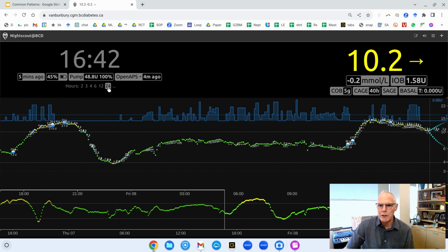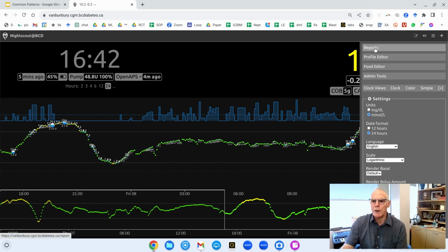Let me see, anything else I want to show you? Not really. Let's go to reports. Reports are ultra powerful. In the top right of the screen, we've got the 3 coins. Click on report.